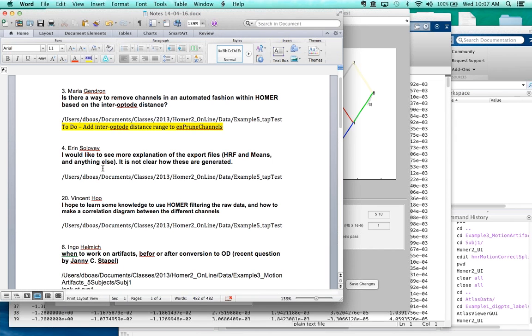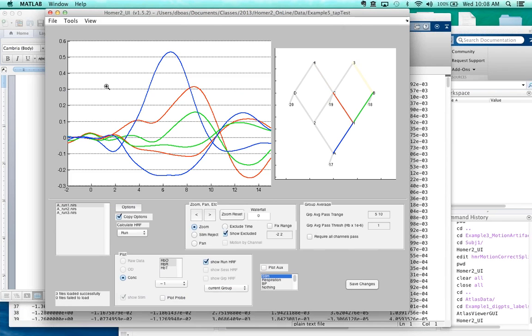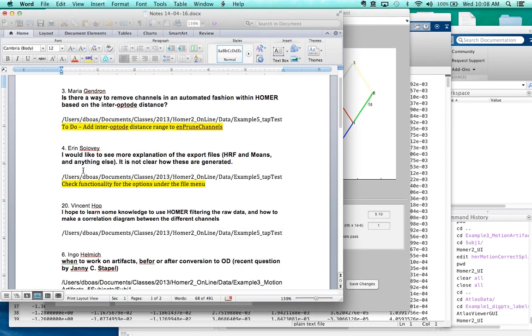Yeah, I actually didn't know that you could do that. I only knew about the ones in the file menu, and so I was doing the export, and they seem to do something reasonable. But there's a table at the top that says, I think, excludes criteria or something, and then there's a table below. Yeah, I understand. Okay, I made a note to go look at those. I think those are kind of there with some historical annoyance.